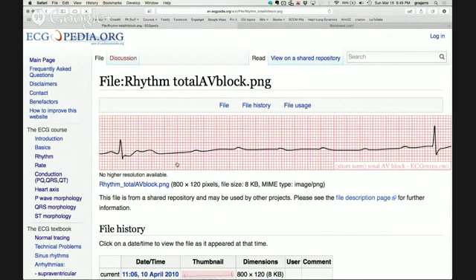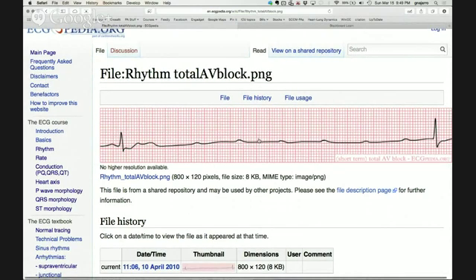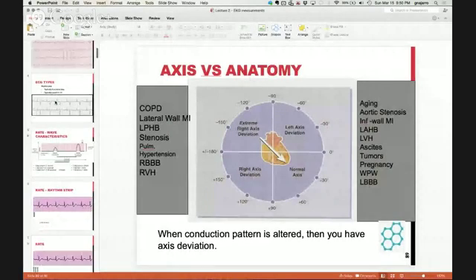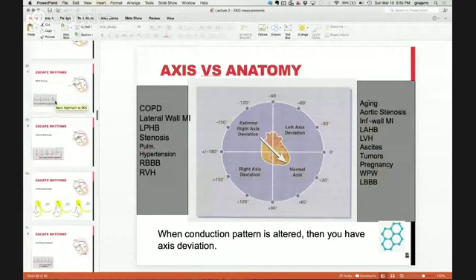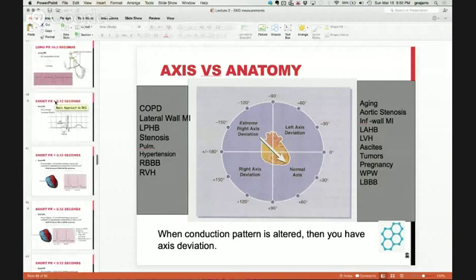So, do you know what lead this is? No, it doesn't say, but it doesn't really matter for this purpose. It's probably lead 2 based on these P waves. P waves should normally be upright and monophasic in lead 2. And I think this criteria is in the second talk, when we talk about P waves, rhythms, AFib, intervals, segments, PR.